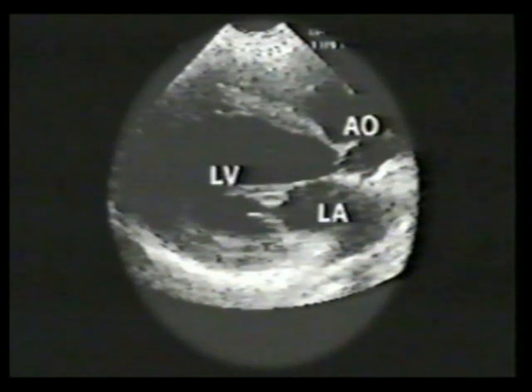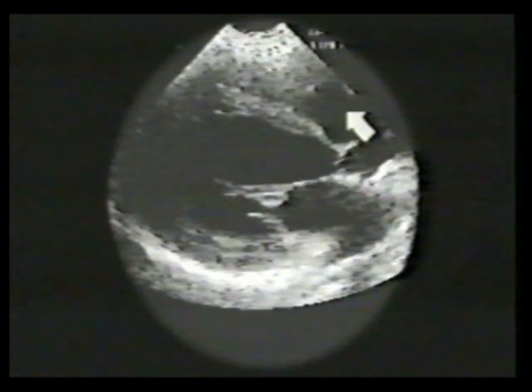Sinus of Valsalva aneurysm results from congenital weakening or absence of the media in one of the aortic sinuses. As in this case, the right coronary sinus is by far the most commonly involved. While intact, these aneurysms rarely cause symptoms.